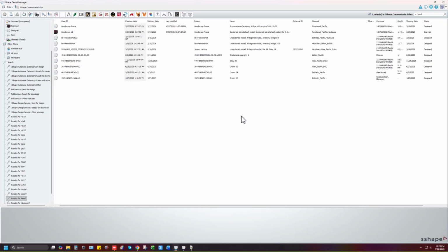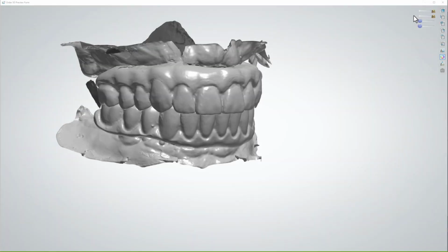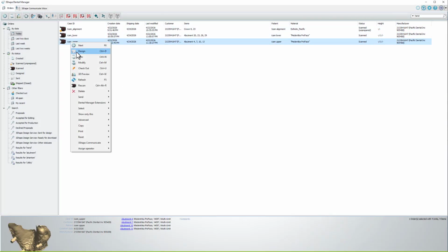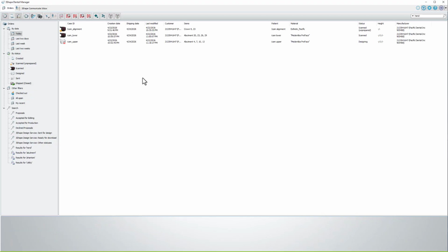If you're going to set it up one way, probably use the DESS library. But just for shiggles, let's do a little experiment here. So we know the DESS.